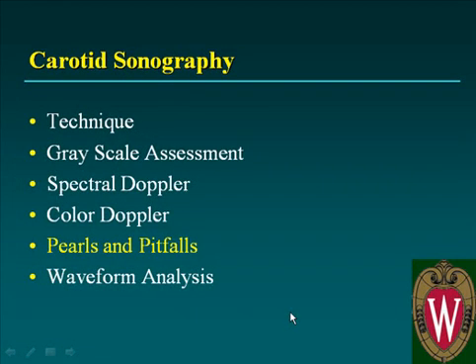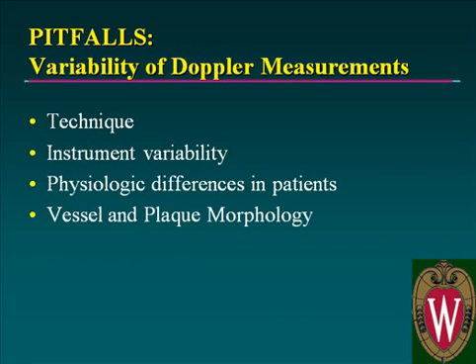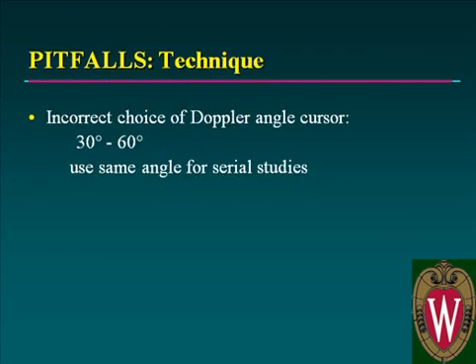I'll conclude the lecture with a series of pitfalls and pearls. First of all, there can be some variability of Doppler measurement based on technique, instrument variability, in other words, one machine to another, physiologic differences between patients, and finally, vessel and plaque morphology.